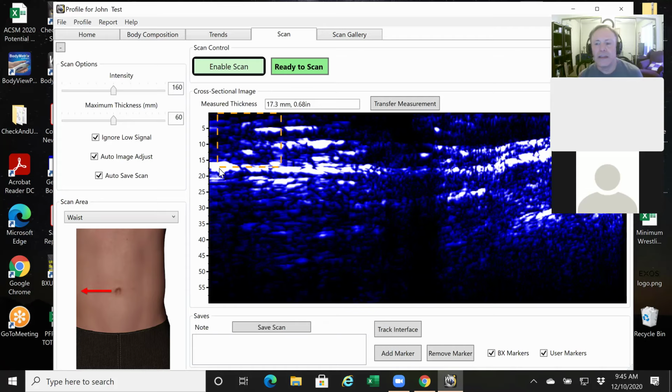Now, getting back to the outlier when you have a really large athlete. We know, number one, if we're thinking about this scale, that individual is definitely going to be exceeding 25 here. And with this particular assessor, he said the measurement came in at 43. Made complete sense. I had him render an image, and we discussed that image. And sure enough, this band was right in here. So for a moment, let's pretend that that band is down here. So this is what I proposed to him. We can identify that band, drag our cursor all the way to the top.